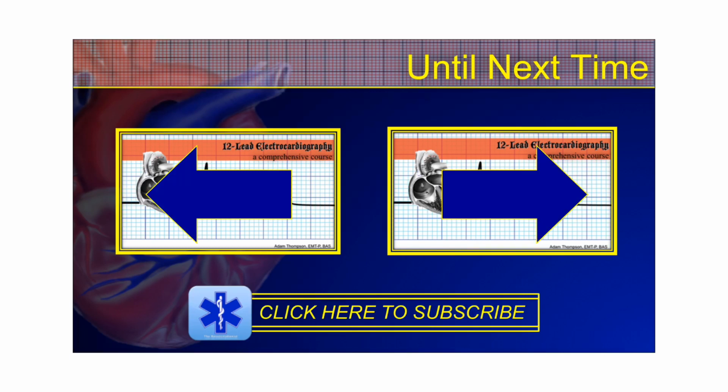So that brings us to the end of this very short second lecture on STE-Mimics, where we talked about left bundle branch blocks and right bundle branch blocks, and how for very different reasons they can mimic an acute myocardial infarction. So we're moving right along with these STE-Mimics. If you want to go back to part 1, you can, or move on to part 3.